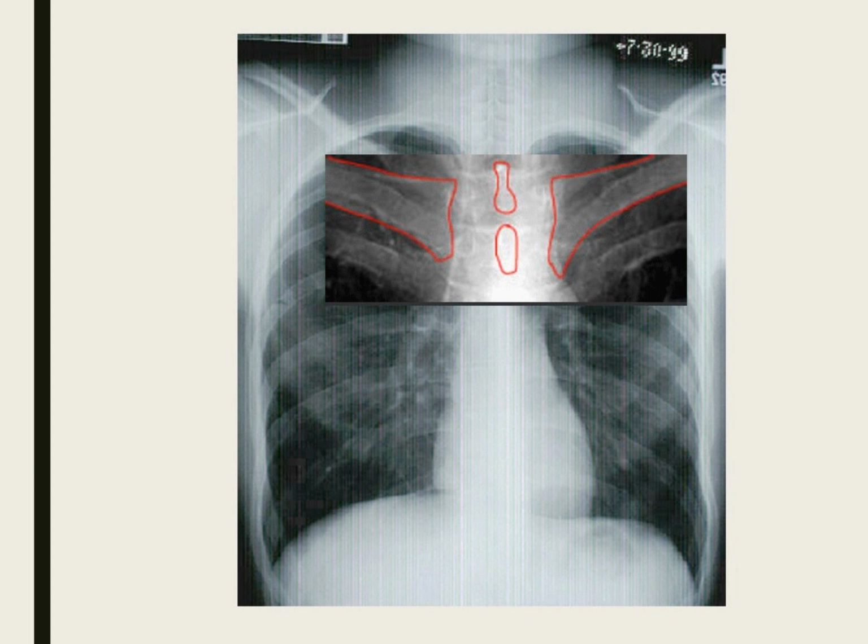The other big thing I didn't mention here, especially in ICU, is super important: get anything out of the way. Any wires, tubes, devices that don't need to be there can be removed out of the field of view. Otherwise we always try to follow every single line. Is this a pneumothorax or is it an EKG lead, right? Where is the NG tube, where is the endotracheal tube? Obviously you're going to leave those. But any leads, wires, tubings laying across that don't have to be there, please take them out of the view.